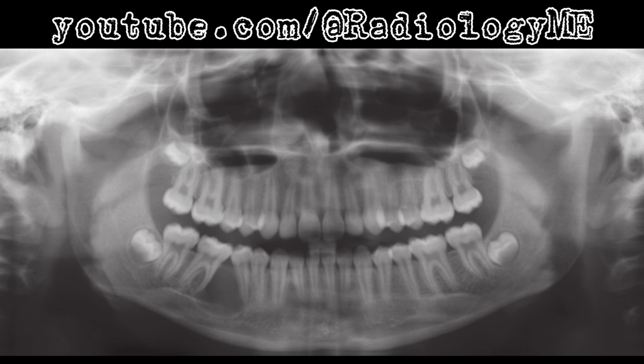So, wrapping it all up, this is most likely a keratocystic odontogenic tumor in a 13-year-old girl, and the next step would involve surgical management to prevent recurrence.